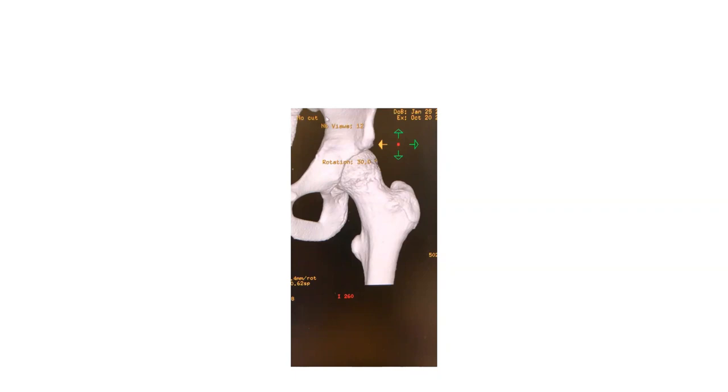I'm not trying to make this tricky, but if you think about it, that makes sense, right? You can look at it and say, that's complete, that's incomplete, that's translated, that's not translated. You could be displaced. When you're displaced, you can be just angulated. You could be translated without any angulation. You can be short without any angulation, okay? But they all are displaced, all right? So describing the displacement is the important thing. And usually describe the direction that it's displaced. So this one is displaced in the radial direction. This one is displaced in the radial direction. Okay, if you say medial and lateral, if you're talking about anatomic position, you'll always be right. But if you're not, you describe the bone.